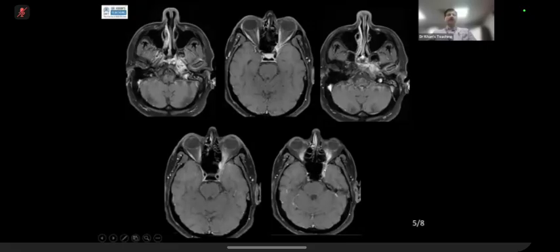When there is cavernous sinus thrombosis, because there is infection there, that infection will penetrate the wall of the carotid artery, and the patient will present with stroke, complete occlusion of the carotid. So look for that also. That should be your pertinent negative: I can see the normal signal void of the internal carotid, but I can see this enhancement. There is cavernous sinus thrombosis.